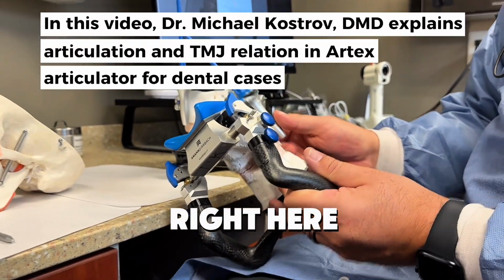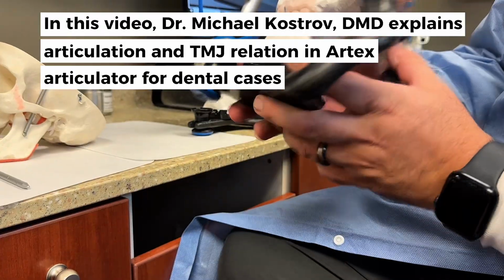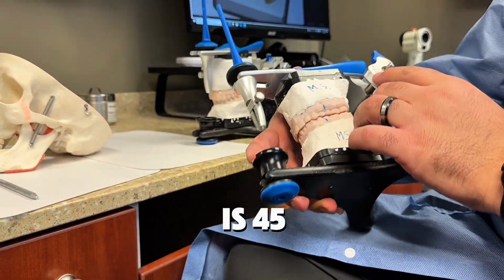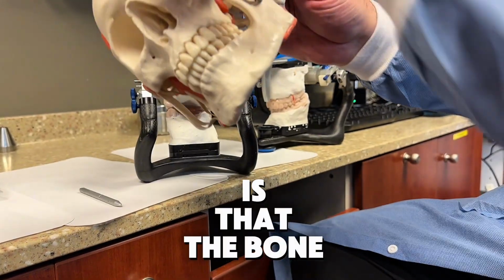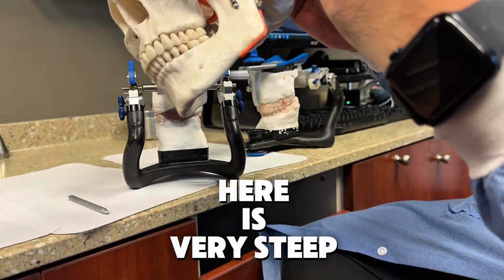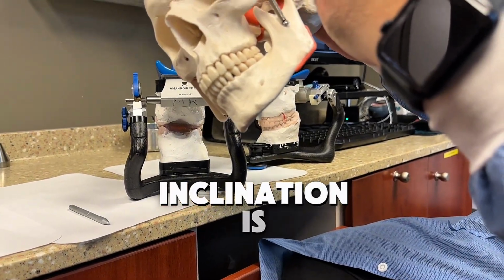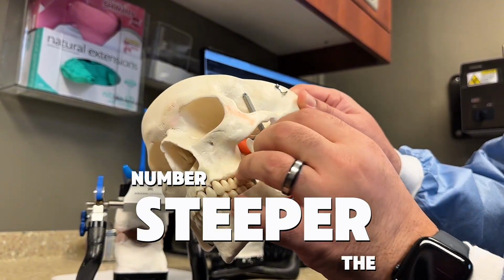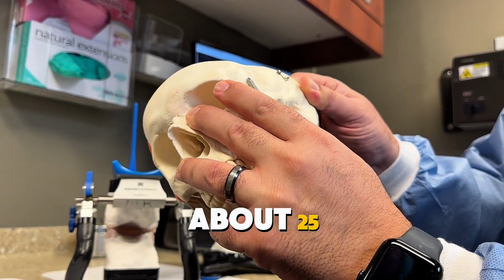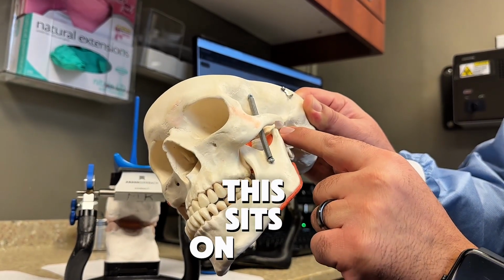On this model right here, we have the condylar inclination set to 45 degrees, which is huge. 45, that's a lot. What that means is that the bone here is very steep. If the inclination is at 20 degrees, the bone's like this. If inclination is 10 degrees, it's like this. The higher the number, the steeper the bone. What's the normal? About 25. Why is this important? To see how this sits on that bone when you move.